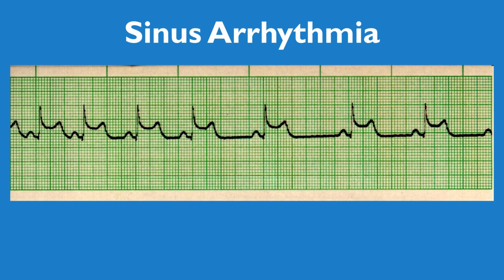My inclination has been to stay away from addressing the clinical aspect of these ECG interpretations, but I am going to make a little bit of an exception for this specific rhythm and talk a little bit about what it means clinically. So if you look at this dysrhythmia in relation to bracketing, it appears like the rate is decreasing, or basically it's going fast to slow and then going to fast again. And that tends to be a pretty common thing with sinus arrhythmias.